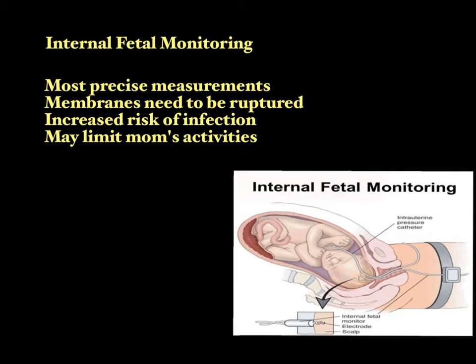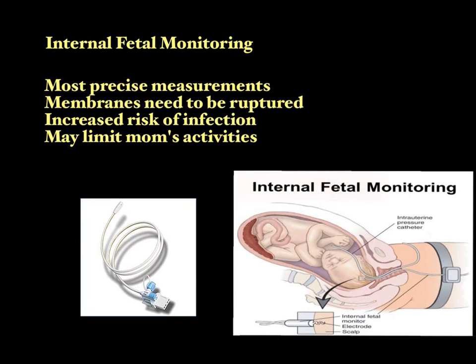pictures of those devices. Here's one. That's the IUPC. And that's what gets sort of snaked through the cervix and either up under the baby's head, or in that picture it's up over the baby's head.